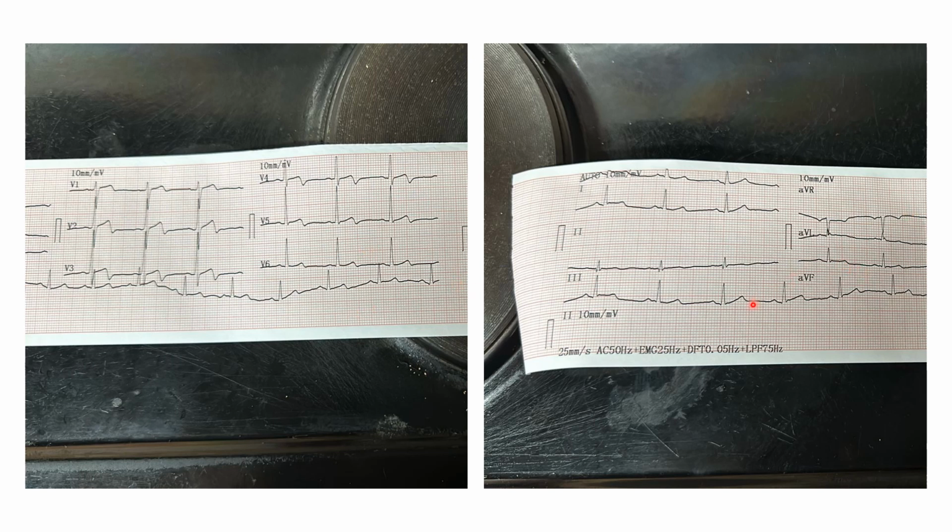So the one thing that you'll notice as you go through is that you don't really see reciprocal changes in this ECG at all. So if we come back and have a look at the rest of the limb leads, if we look at AVR, we notice that there's not much wrong over there. And if we look at leads 1 and AVL, which are your high lateral leads, we actually see a bit of ST elevation there, but very mild.